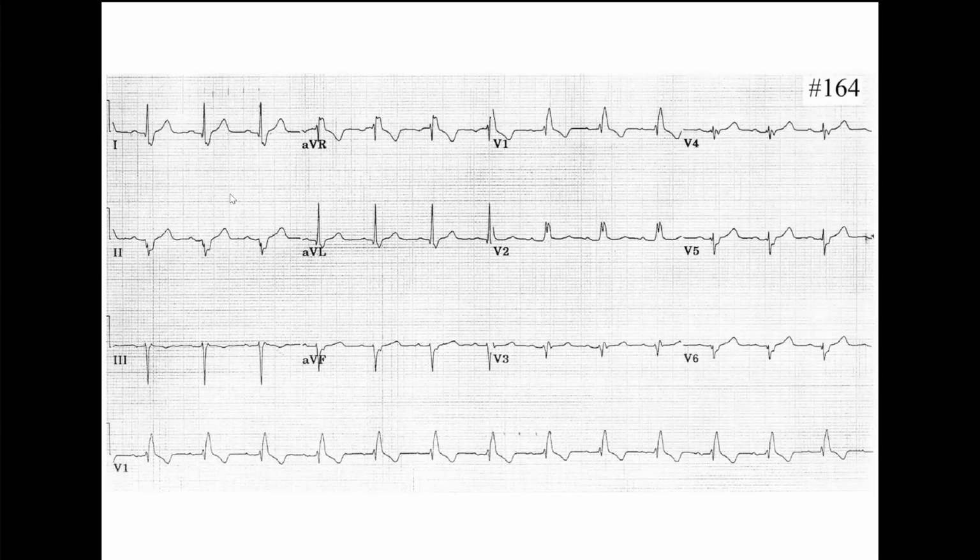Yes. And why is the QRS wide? I'm not sure about that. Yeah, you know it because you jumped immediately to V2. Yeah. Because of the right bundle branch block? Yes, that's it, because we do have an intraventricular conduction abnormality.